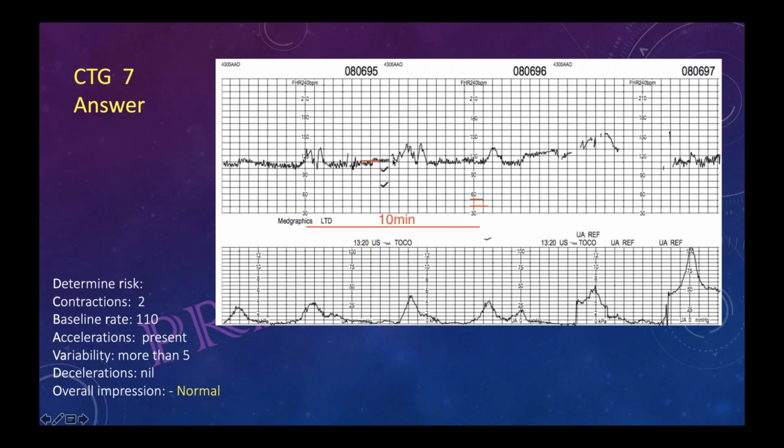It should be free from acceleration and deceleration. So ideally when we calculate baseline, there should be no contraction, no acceleration and no deceleration. If we see here, the baseline will go here. So this way calculation of baseline is done.